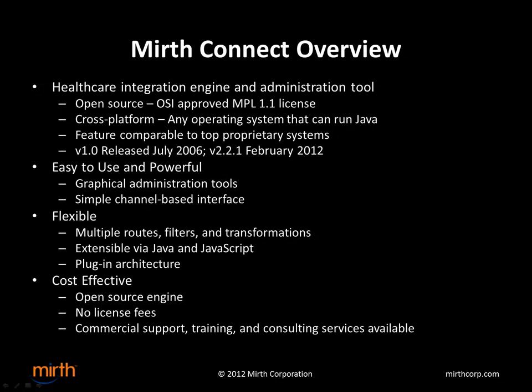Mirth Connect is very easy to use and powerful, as I'm sure you're going to see in the demonstrations that I give shortly. It has many graphical administration tools that you can use, and it uses a simple channel-based interface architecture where you configure your channels on your server in order to do your routing, filtering, and transformation. So it's very flexible. You can configure multiple routes, as many filters or transformers as you want, and everything is extensible in Mirth Connect via Java and JavaScript.